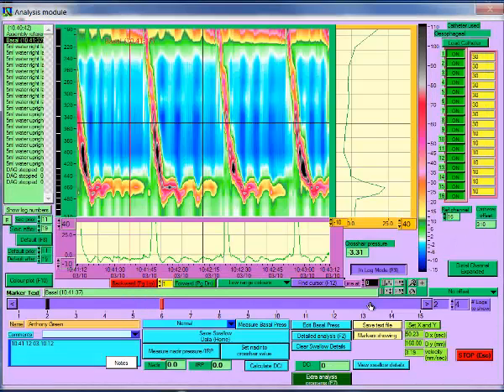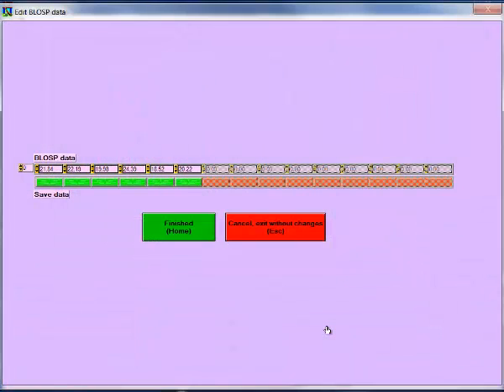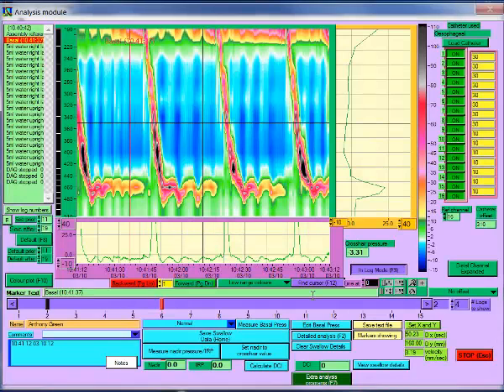You can repeat this process as many times as you like to build up the number of basal pressures that you have measured. After returning to the main analysis screen, you can see what the current basal pressures are by clicking on Edit Basal Pressures, which allows you to see the currently saved pressures. If these are incorrect, click on the green button below the incorrect pressures, which will turn red, and these will be deleted when you click on Finished.